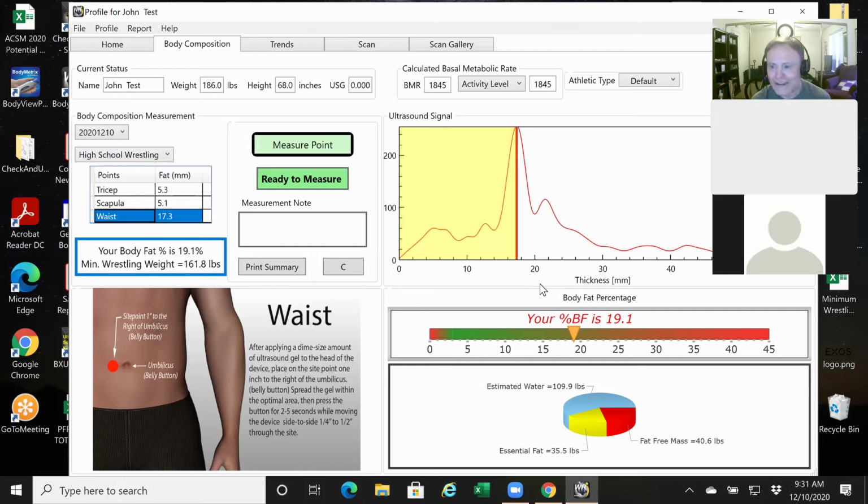Kids that are lean, okay, getting back to the lean and default. When you create a profile and you designate an athlete as lean, that's telling the software to look for a strong dominant peak somewhere on the extreme, maybe 2.5 to 3, between that and 10, which makes sense because kids, adults for that matter, that are lean in the abdomen, their fat is sub 10.